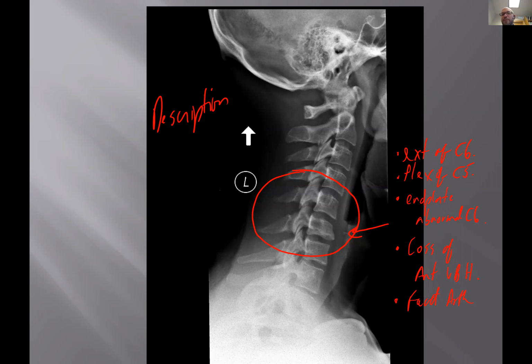Now look at the interlaminar spaces, the spaces posteriorly between the lamina. What do you notice? There's some subtle posterior osteophytes into that IVF. Yeah, there might be, although that would be better to see on an oblique view, so I'm going to pass it because they're super subtle. So keep looking at the interlaminar space, or the distance between the lamina. Well, it's increased. What do you notice?